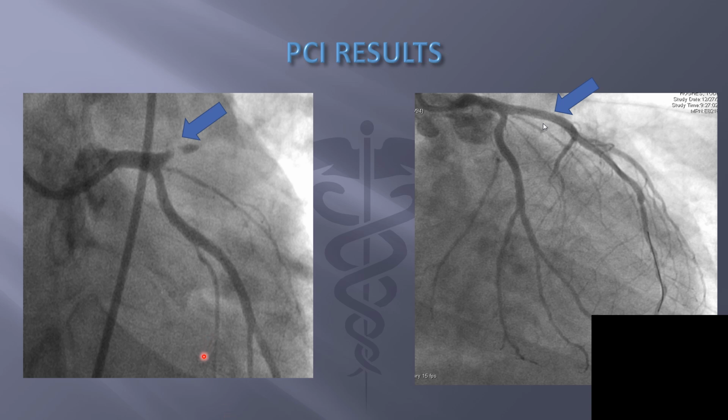And this here you're going to note on the angiograph that the LAD was 100% occluded. And then this is after we place the stent during the cardiac cath, and you're going to see how much reperfusion they have after the stent is placed.